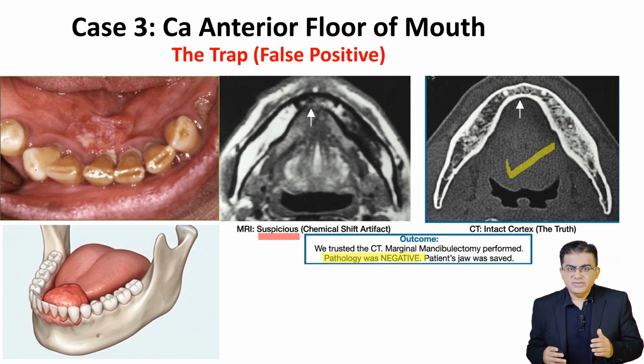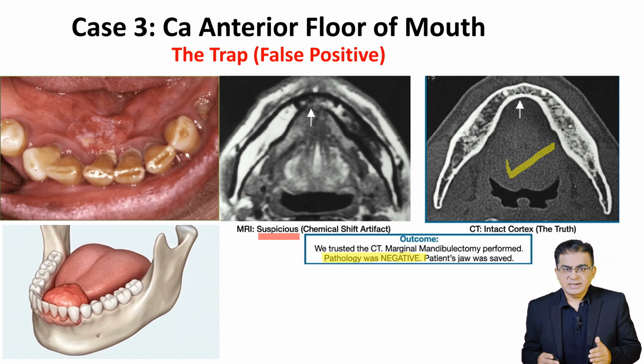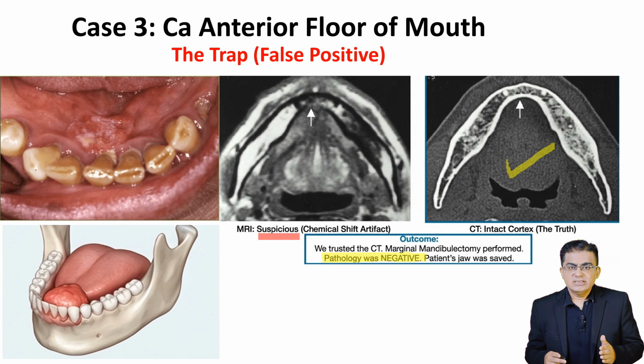I hope with these 3 patients as examples, you are clear that for lateralized tumors, you should say CT scan in exam, not MRI, not PET-CT.